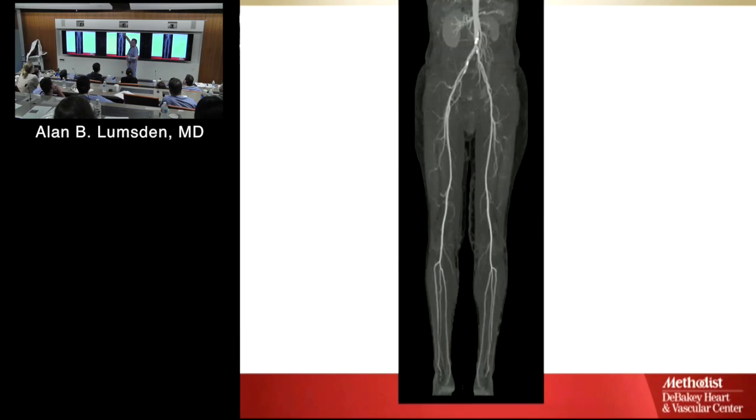I'm going to walk you down. What's that? No, give me which part of the aorta. No, ascending? No. Descending. Okay, but where? We're in the abdomen here. Typically, you refer to the descending as in the chest. We're in the abdomen, so we would say this is suprarenal aorta.